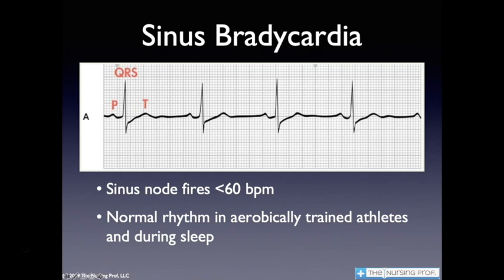On the other hand, we can have a sinus rhythm that is too slow, and that's a sinus bradycardia. So let's take a look at our EKG. In this case here, now, assuming again a 6-second strip, we have 4 complexes. So we have a rate of 40.